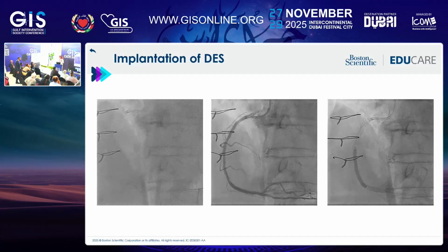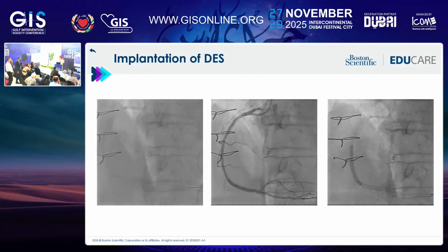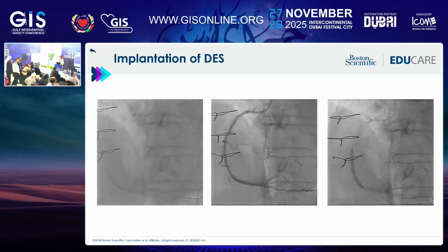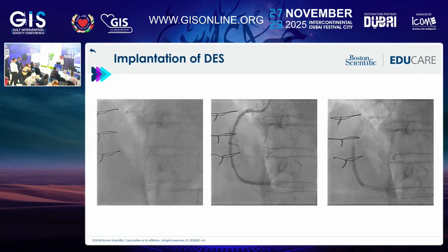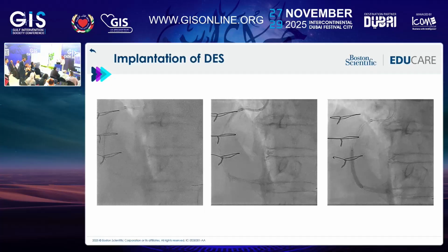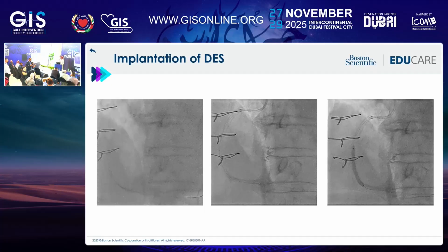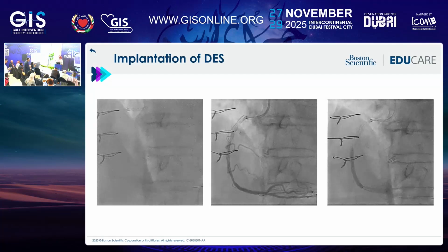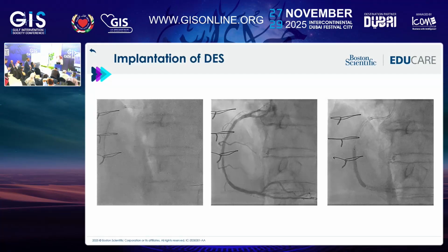2.5 to 2.75. And the reference area is approximately 3 to 3.5. Okay, so synergy, if you took a 2.5 synergy, how far would it go? But the 2.5, how?